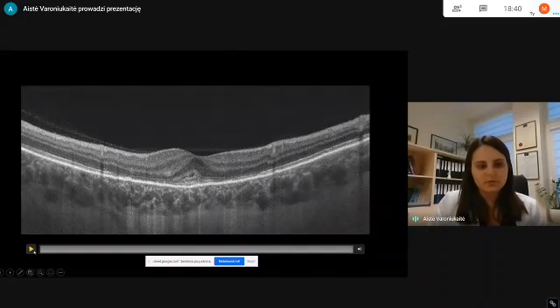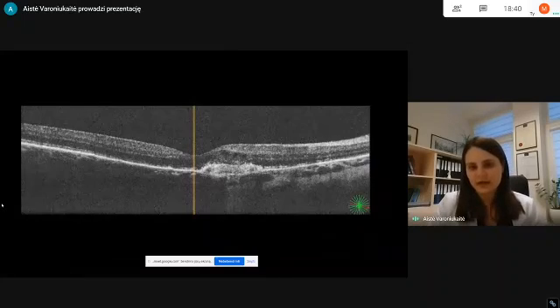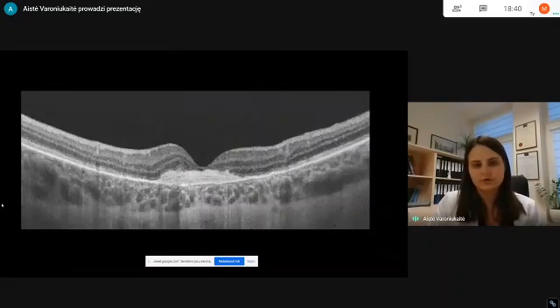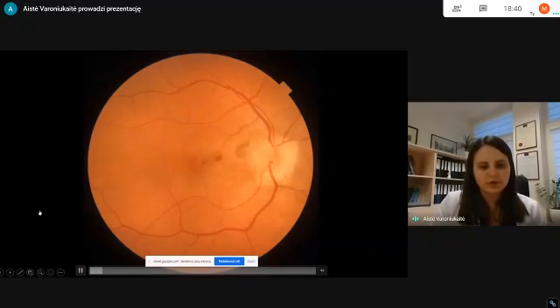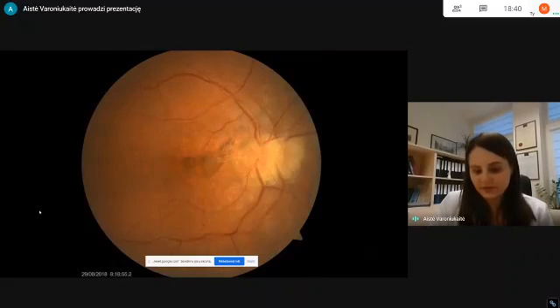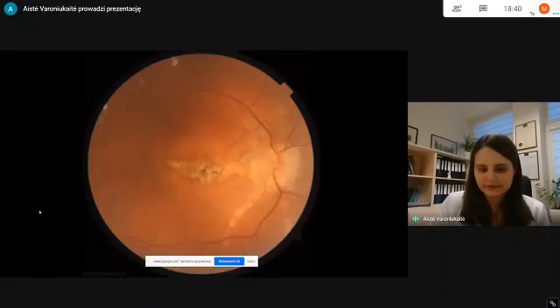In this short video, I would like you to see the progression of the patient's active choroidal neovascularization and formation of a scar in the optical coherence tomography imaging. Another short video is also really important because in it, we are able to witness the progression of this patient's fundus lesions in the right eye. It progressed during the years 2018-2020, and as you can see, the diagnosis becomes more clear as the disease progresses.